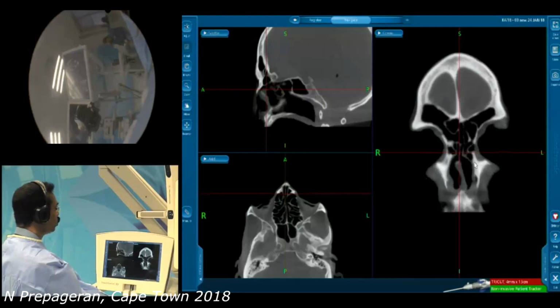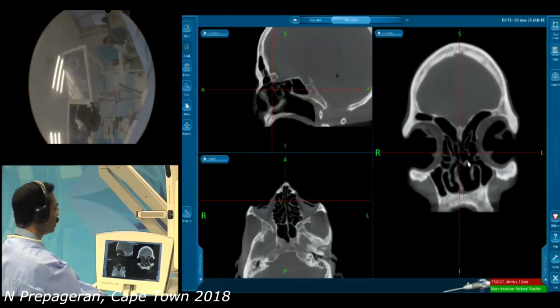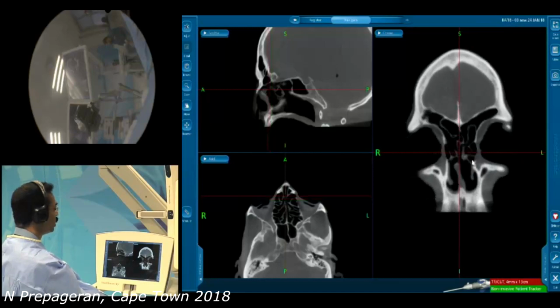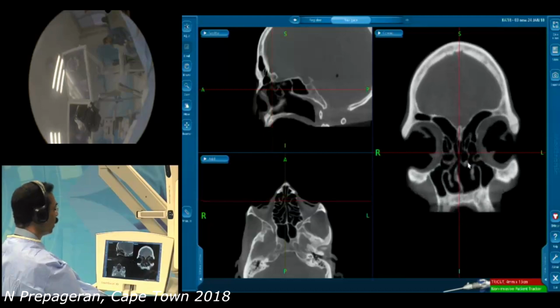So what makes this unusual is that this is probably the uncinate process here, and you can see how pneumatized and abnormal the uncinate process is before it gets adherent to the middle turbinate. It's almost as if the uncinate process, which is usually attached to either the orbit, or the lamina papyracea, to the skull base, or the middle turbinate, is dilated or has got a very pneumatized and adherent to the middle turbinate here, thus occluding the access to the maxilla as well.